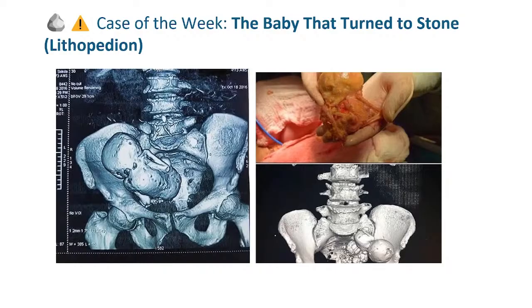I also have a challenge for you before I reveal the final diagnosis. I want you to carefully study the images and tell me in the comments what you think this lesion is. Could you diagnose this rare condition before seeing the CT scan?